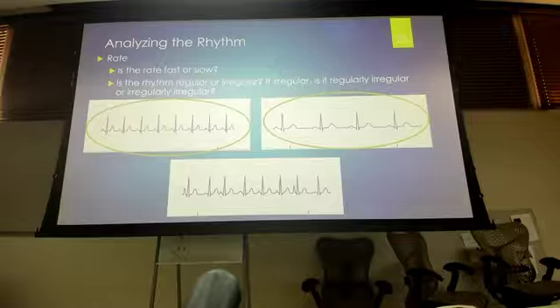Sometimes you're looking at it like, I don't know, I'm not really sure. Get out your caliper, get out your piece of paper, and really make sure that that is in fact regular. We want to make sure if it's regular or irregular. And again, yes, it's wordy, but irregular is a thing, and we specifically will see that with something like atrial fibrillation.